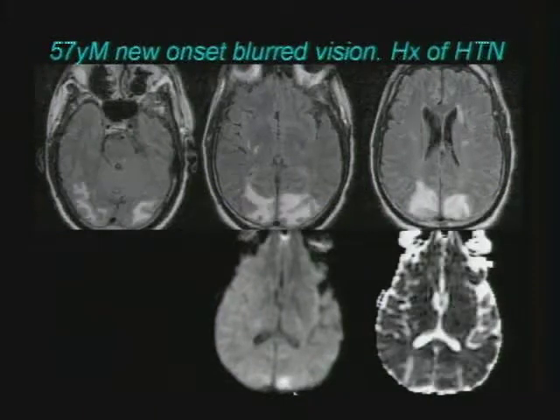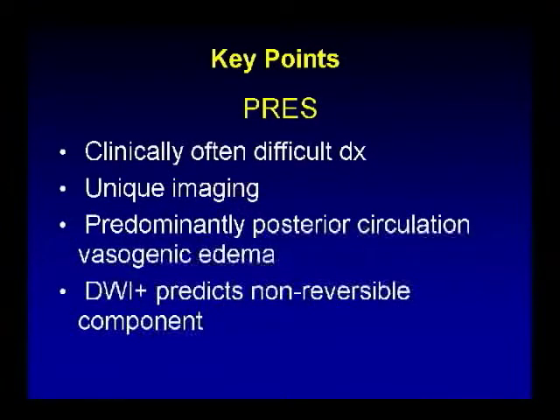Notice that it is nowhere as big as the whole area here of T2 abnormality. This is restricted diffusion, and this is one of the complications. About 10% of patients will go on to have either hemorrhage or infarcts in association with their PRES. But this is the non-reversible bit, so this is the value of diffusion here to tell you most of this process is vasogenic edema. There is a small infarct in this patient.